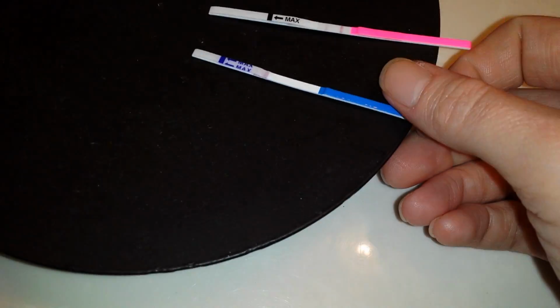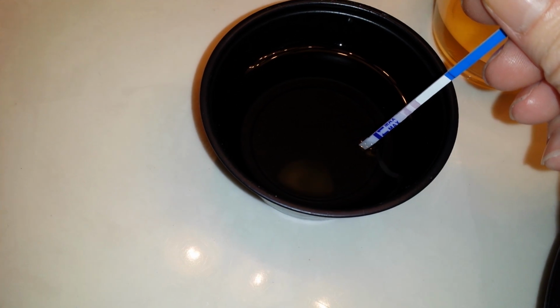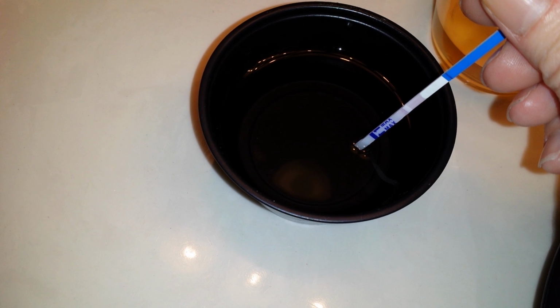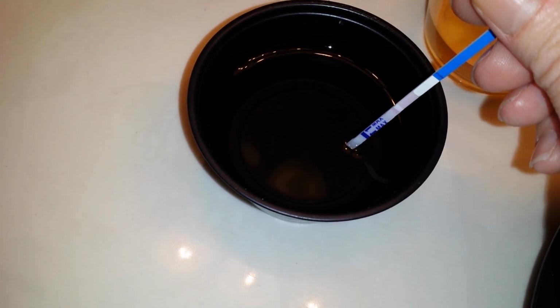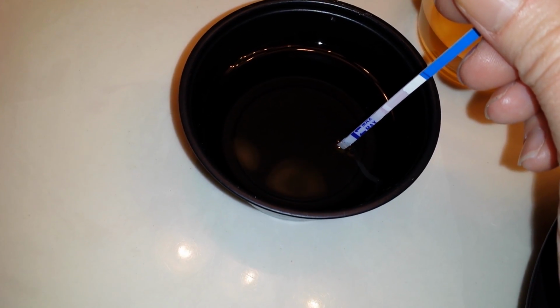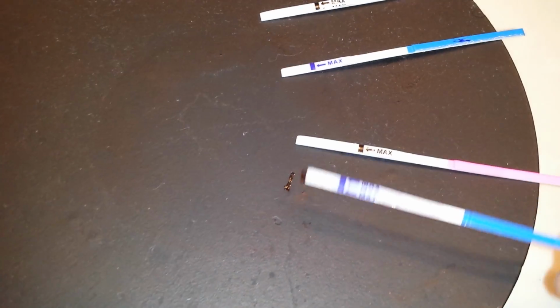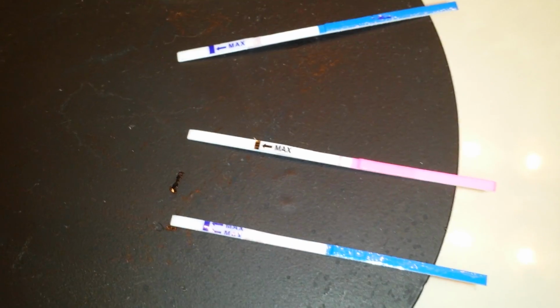Okay, so with that being said, I'm going to go ahead and dip the pregnancy test. And we will watch as the dye runs across.